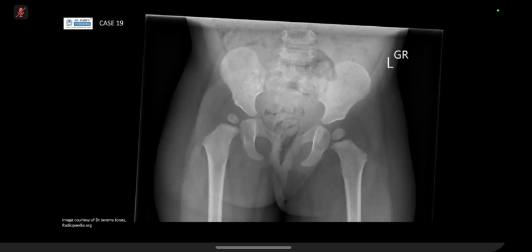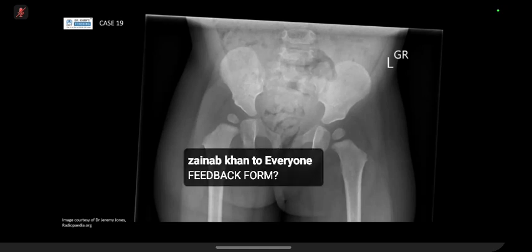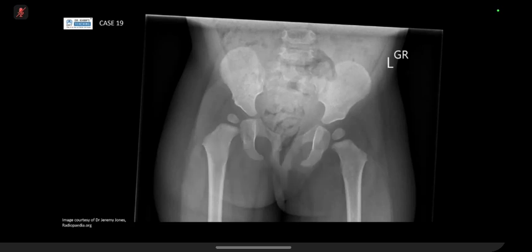Yes. Okay. I will check if there are any signs of DDH, hip dislocation. As I can see at the right side, there is mild disruption of the Shenton line, and the femoral head epiphysis is slightly smaller, asymmetrical. I want to see the Hilgenreiner line, if the femoral head is within the medial two-thirds, and if there is soft tissue swelling or elevation.